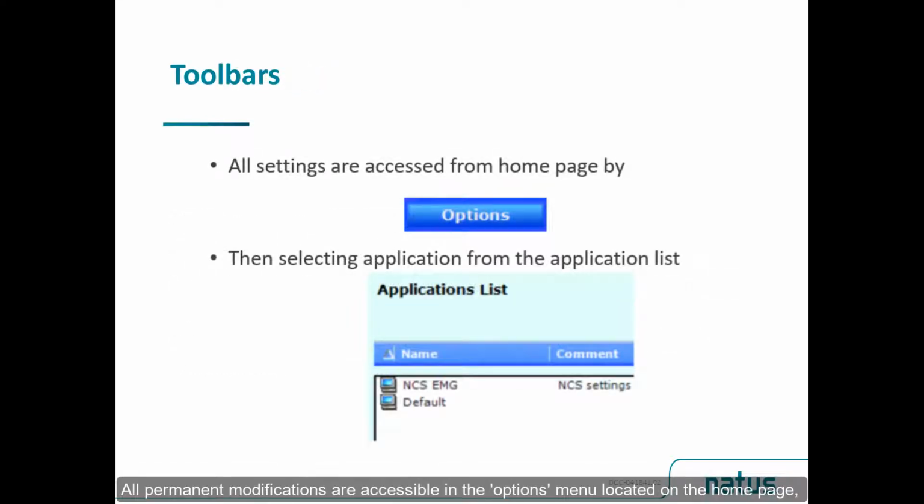All permanent modifications are accessible in the Options menu located on the home page by selecting the same application as the one displayed in the test menu. Changes for current studies only may be operated directly on the exam window.